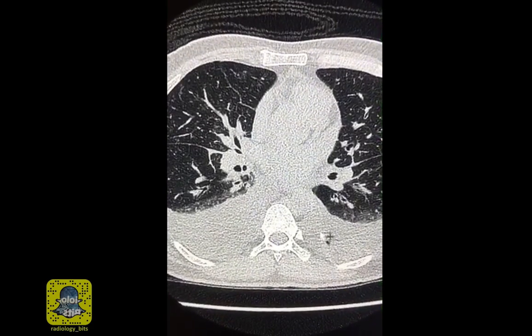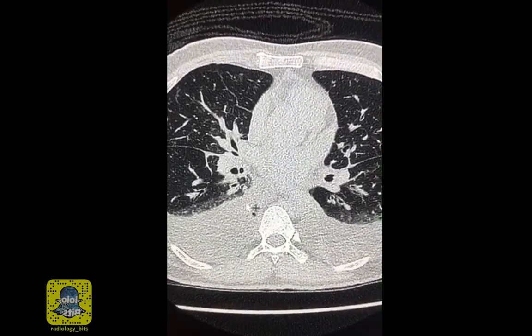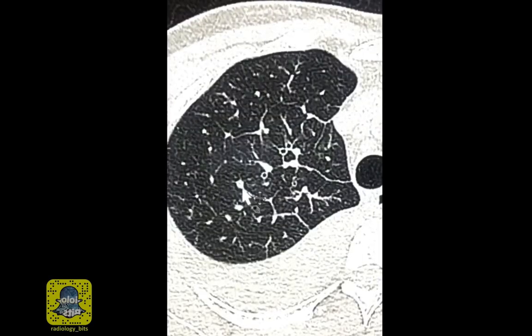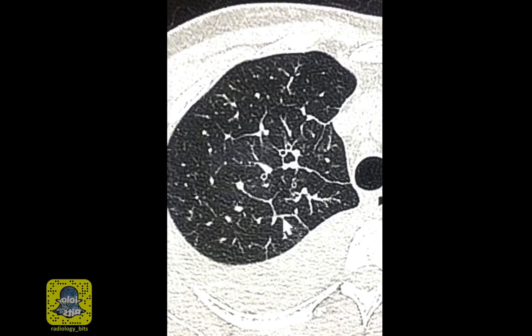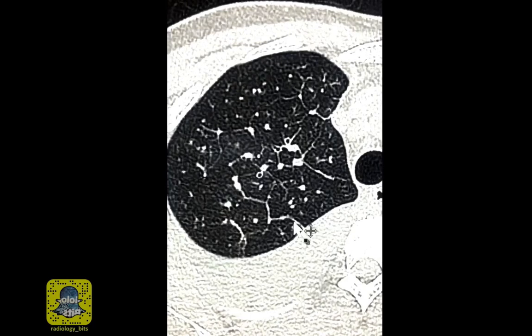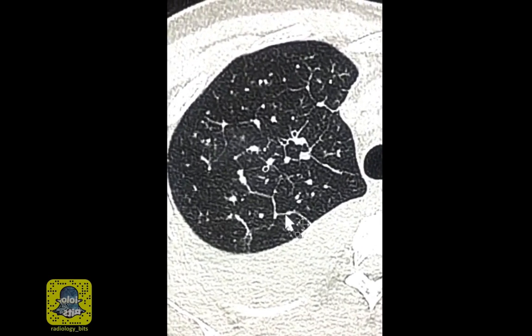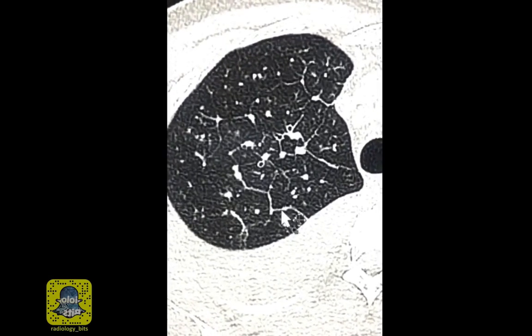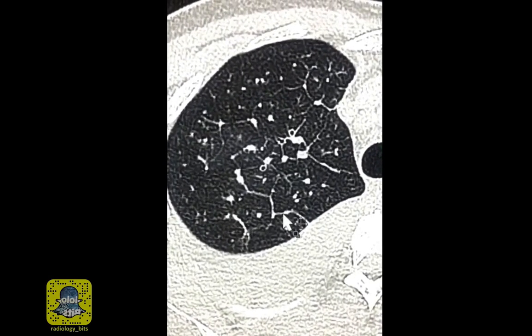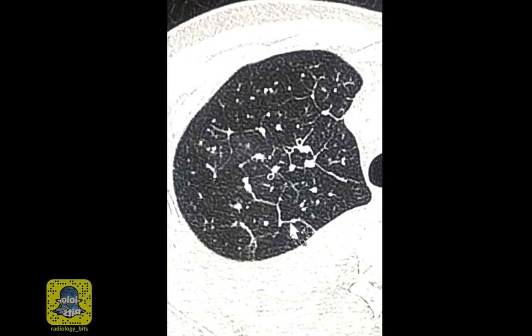The patient has bilateral pleural effusion, and he has lung changes that I want to emphasize today. We have all those thickened lines which are not usually seen in a normal lung. This is thickening of the interstitium. Now, what is the interstitium? It is basically the connective tissue network that holds the lung. In many ways, this connective tissue background acts as the lung's skeleton.